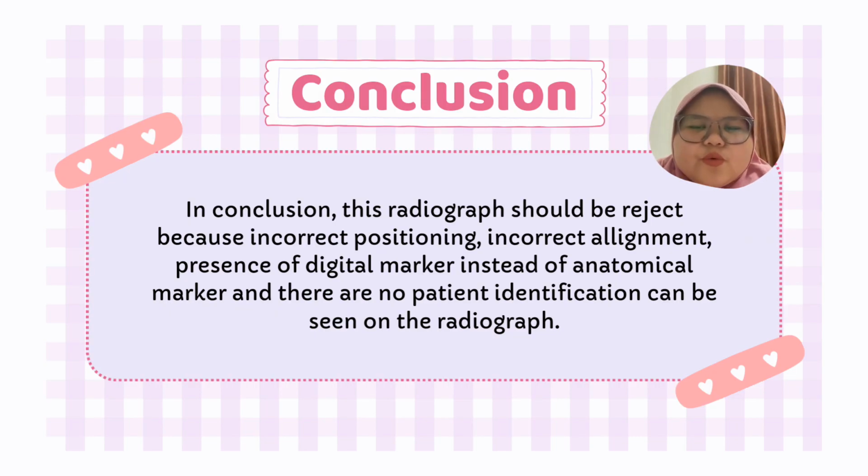In conclusion, should we accept or reject this radiograph? In my opinion, this radiograph should be rejected because it has incorrect positioning, incorrect alignment, presence of digital marker instead of anatomical marker, and there is no patient identification seen on the radiograph.